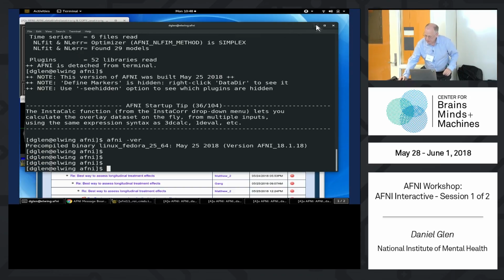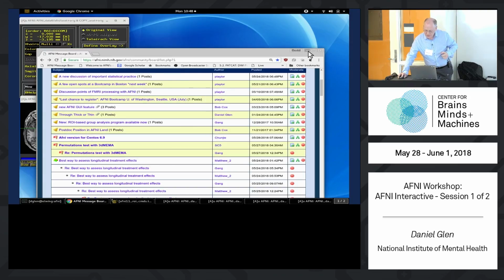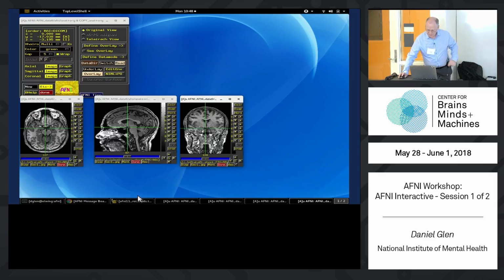Okay, let me bring that down. Okay, so take this out of the way. All right. Okay, so what do we see first?